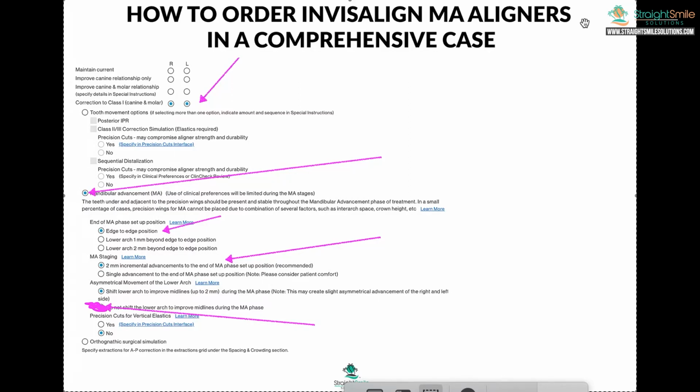So literally everyone's so confused about this. I'm going to walk you through the preferences, how to submit a case, and what I think it means. It doesn't mean it's right. So, okay. In order to opt in, it's secret. It's super secret. It's like going to Starbucks and ordering one of their secret drinks, or going to Chipotle, oh no, I know, better one, In-N-Out, and getting one of their super secret combos that's not on the menu. That's how I kind of think of this.